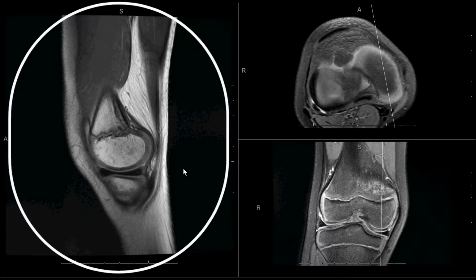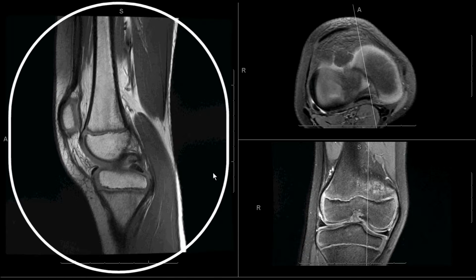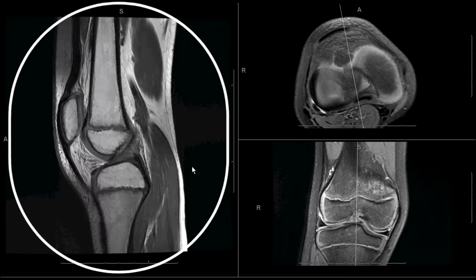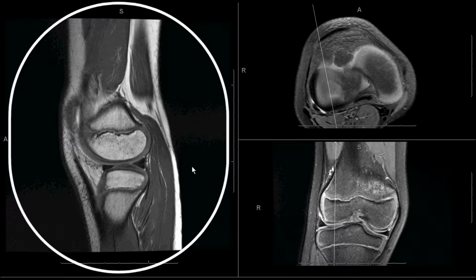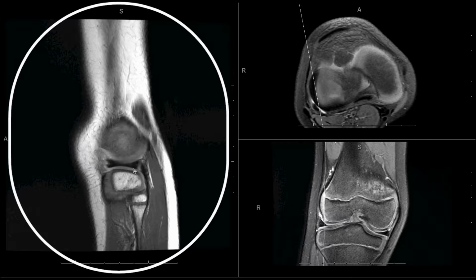We go from medial to lateral and see that the medial meniscus just gradually fades out into an anterior and a posterior horn with a body in the middle. We come to the intercondylar notch at the site of the root of the meniscus, and we must interrogate that on all images. We come out into the lateral meniscus, and we see again that uniform dark signal intensity with two parts of the bow tie but absence of the body. Keep moving out laterally and you see portions of the body, and then here is the true bow tie.